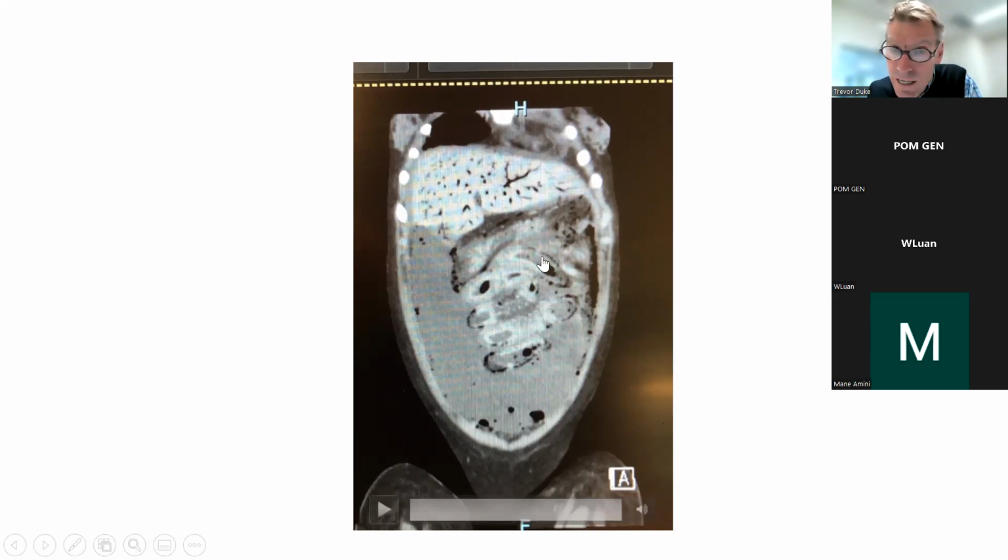Yeah, where's the air? That's right, Benji. Where's the air? Throughout the bowel. That's right. And of course, you normally have air within the bowel. But what can you see here? All these small dots, these black dots. What do they look like? It looks like air. What would you call that? What would you call these black dots then?